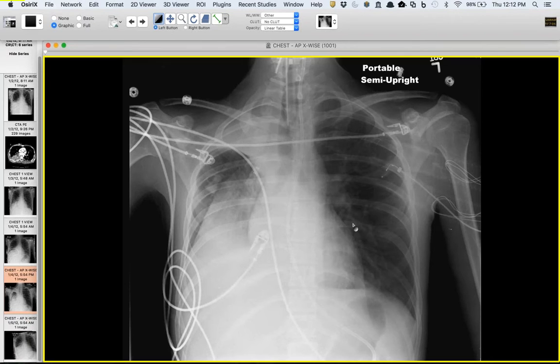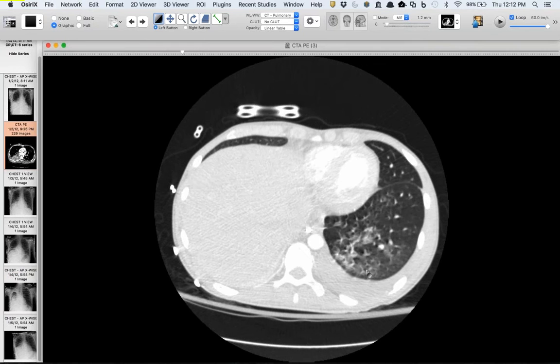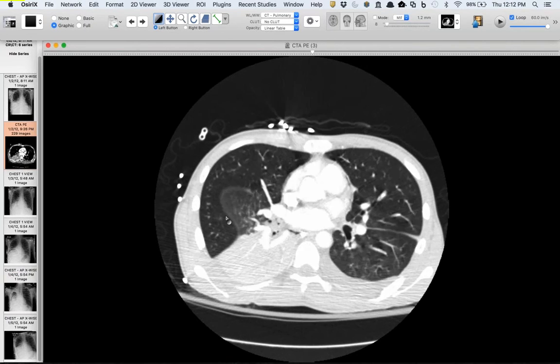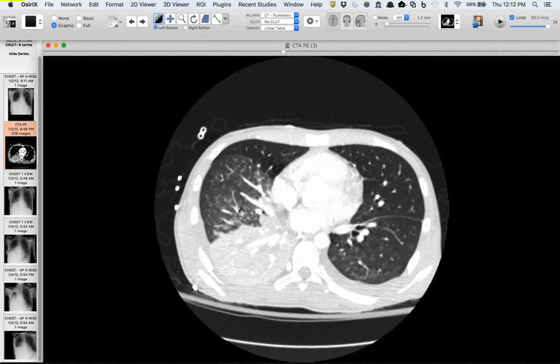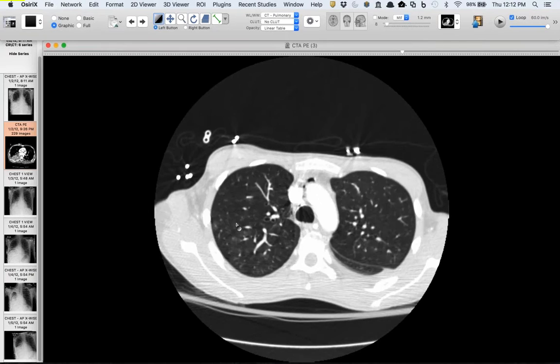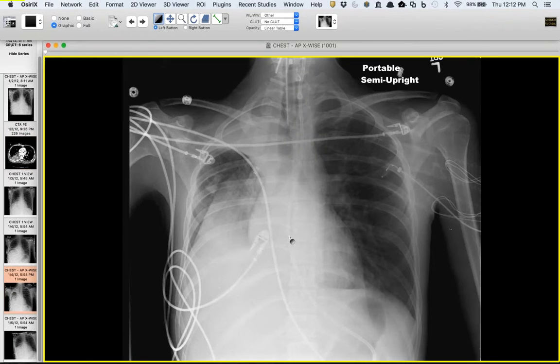Wow. Yeah, and then whatever this is, if it's more atelectasis or if he aspirated here, I don't know. Here's the CT. Yeah, it looks like he's got some more discrete centrilobular stuff in that right lower lobe. This was earlier, a couple days before, and you can see his right lower lobe, and then a little bit of presumably just aspiration or something going on in his right middle lobe as well. And then his right upper lobe collapsed after that. But yeah, that one's really interesting.